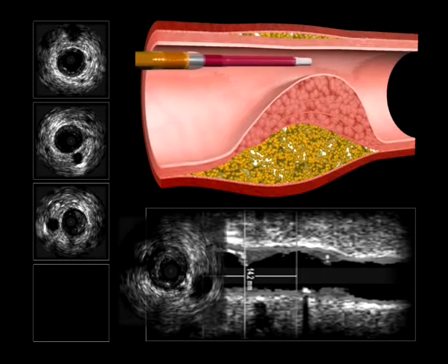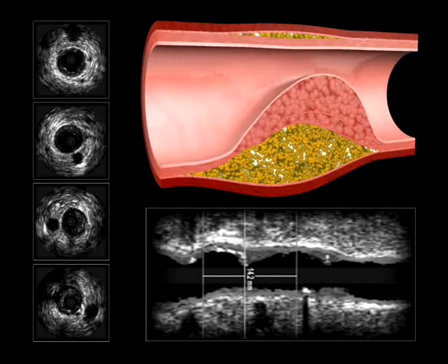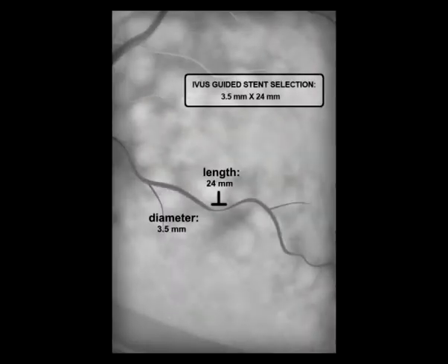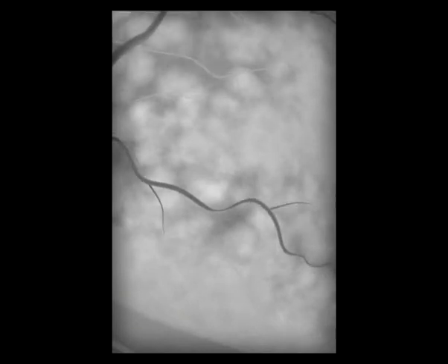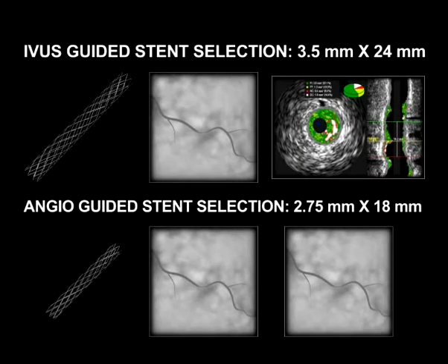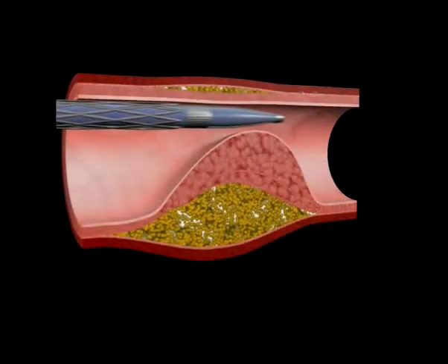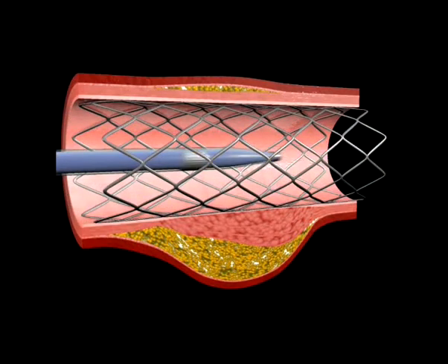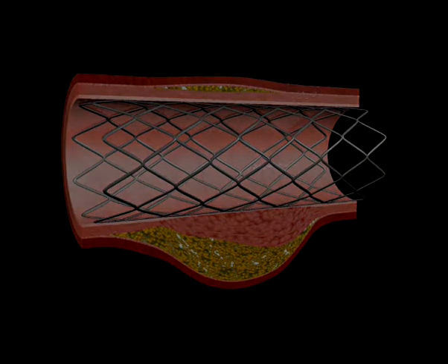Because of these inherent limitations of 2D angiography, physicians have looked to IVUS to provide more detailed images and measurements to confirm proper stent placement. Proper stent sizing and placement is essential to long-term outcomes. Volcano is committed to patient care and providing physicians with the necessary tools to optimize treatment regimes. Finally, utilization of Volcano IVUS provides information that gives you confidence in your results.